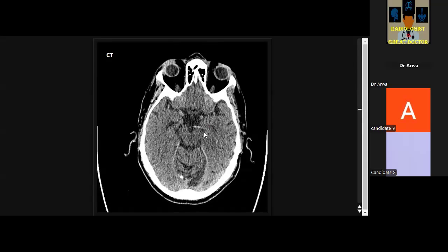Here it's a dense vessel sign in the posterior cerebral artery. For thrombectomy or intra-arterial catheter injection, I think, not embolization. MRI is better, of course. Very good. This is an example of hidden cases.